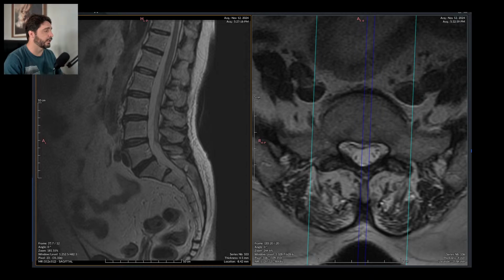So I think we are getting faster in this reporting business. We are already 17 scans down. I had just another lumbar spine, but it seems they have sent me another one.